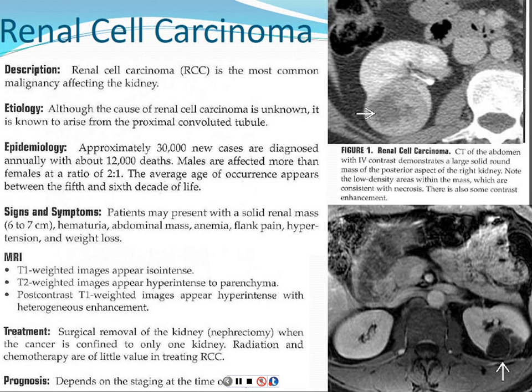I don't think there's any definite known risk factor to them. They just kind of show up. They usually show up in older patients. Many times they grow very slowly even when they show up, so it may take a long time for the patient to present. Sometimes they'll feel some pain. Sometimes it'll be just incidentally discovered on imaging. And this one looks fairly solid and is enhancing, not as much as the kidney, but certainly more than a renal cyst would.